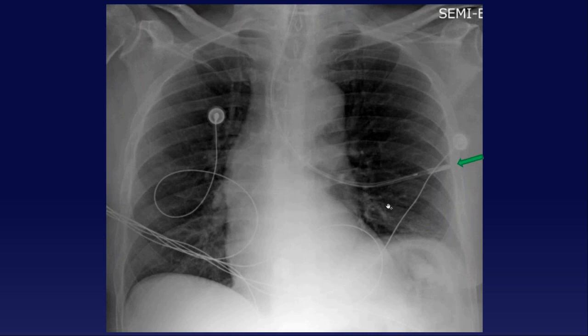Here's another good one. Ooh, this is a bad one here. Anyone know what happened on this one? You've got the arrow sign to help you. Some brave soul. I think it went into the left mainstem bronchus into the lung.